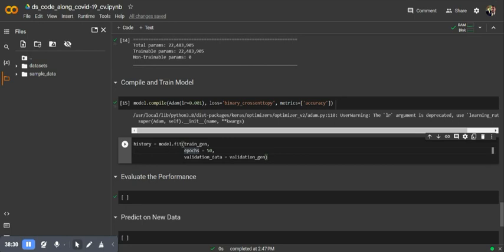We'll say our batch size will be 10, and what that means is that 10 images will be passed into the network at a time in each given epoch. And an epoch is a single pass of all the data through the network. So if we've got 1,000 images with a batch size of 10, it'll take 100 passes to make a full epoch.